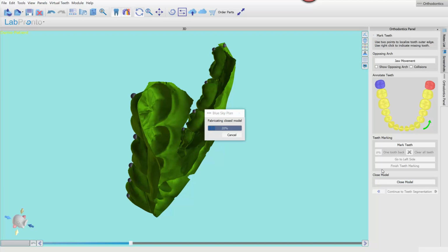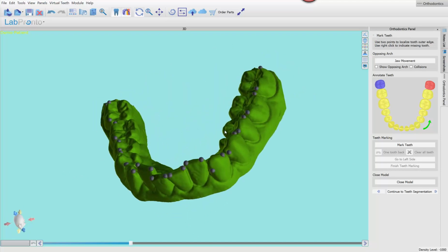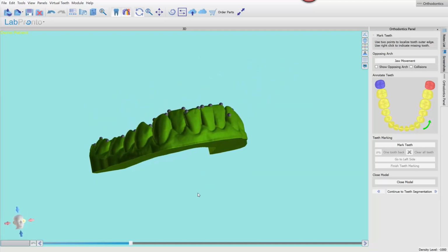By the time you watch this video, we'll have some new updates coming out very soon, so some of these features might not be the case, but it should be pretty obvious. This video is not going to be a bad video based on the updates. It's just that you might not have to do all the steps I'm doing here. So let's continue to segmentation.